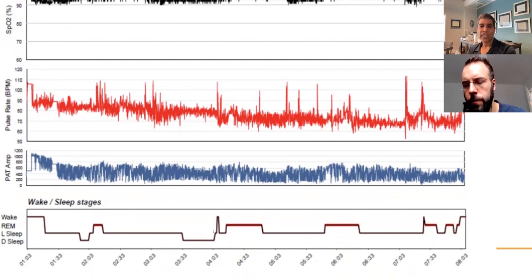One thing I look at here is how often do they wake up? Oh, they woke up once, they woke up twice. A lot of people do wake up once or twice. That's normal during the night, just to wake up and go right back to sleep. So this is a little unusual. How can someone who has ultra severe sleep apnea at 65 interruptions per hour with trivial drops in oxygen, yet they don't wake up more? It just doesn't seem to match, right?